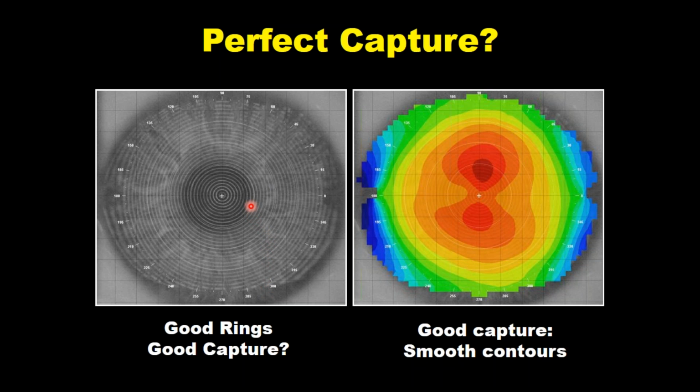Now, once we take that image and we've saved it into the file, that photokeratoscope image is converted to a colorized topography. How do you know that you have a good map? One of the ways is to look at the contours. All of you have seen many, many corneas behind the slit lamp. You know that a healthy, normal eye has a very smooth anterior surface shape.